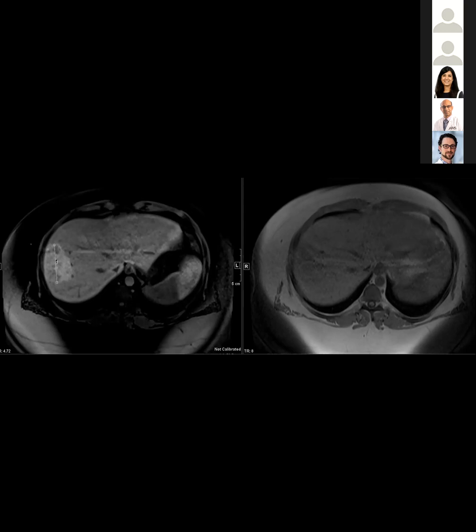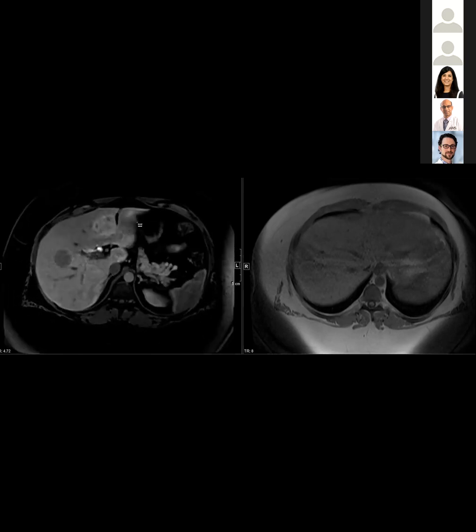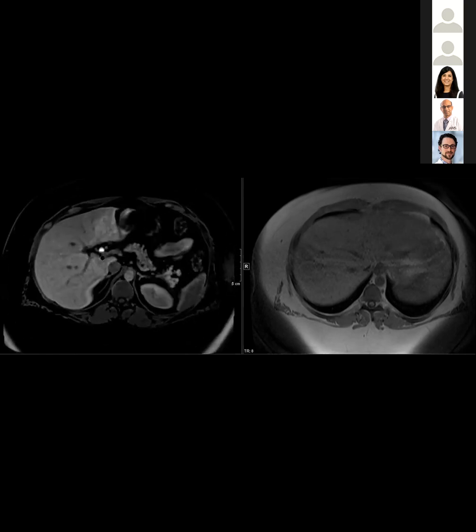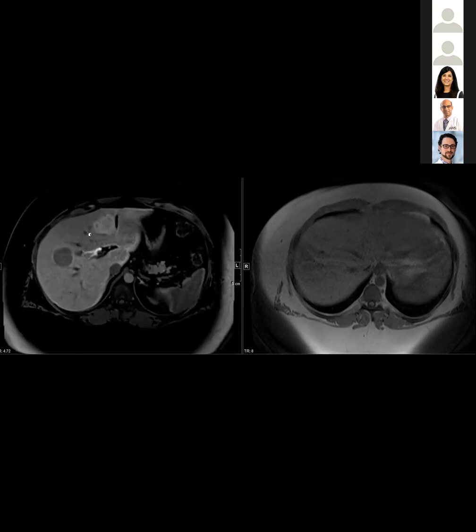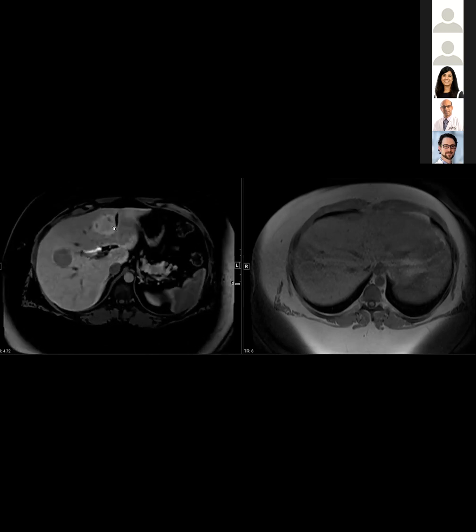Yeah, it's a cool example of retention on the Eovist. Right. But like more heterogeneous retention. Right. But also it's very interesting because, again, in the same patient, the same environment, this patient developed very distinct adenomas. I mean, I don't have a path, but you can see that they behave quite differently, these two things.